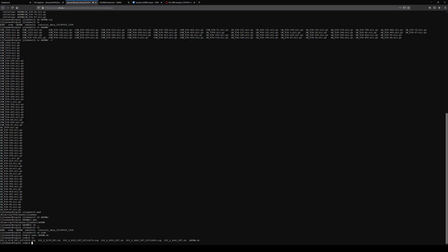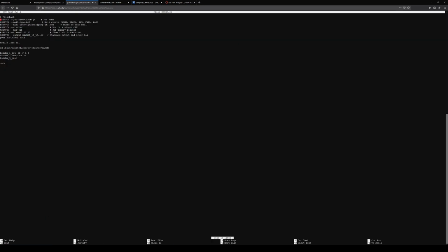And I just realized I need to change my account. So let me add 2 more lines to here. So I'm doing this in nano. So account, I'm just going to put the class account.